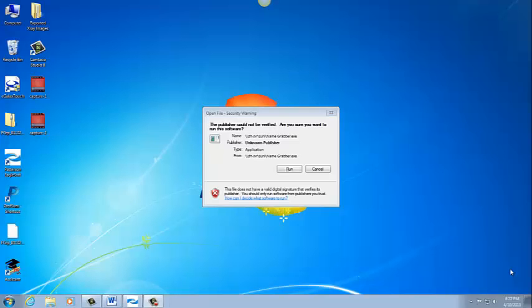Alright, this video is going to go over detailed step-by-step instructions on how to use the SUNY sensors with Eaglesoft. So traditionally SUNY and Eaglesoft are not compatible systems, but they are with a certain bridging software called NameGrabber.